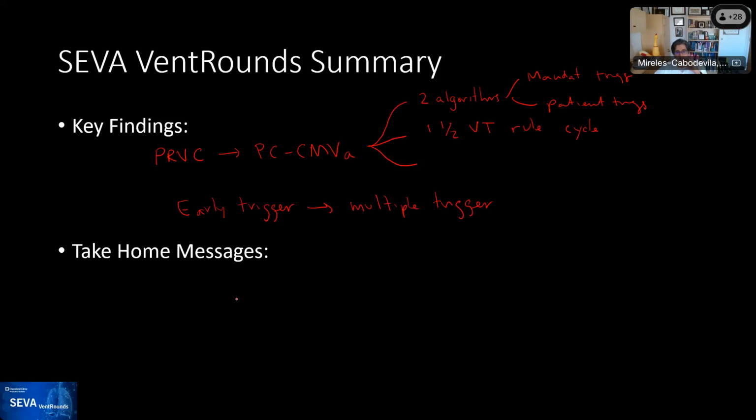So what I would say in general as a take-home message is that you need to learn this careful observation of your ventilator, which will give you more insight into what is only on the manual or may not even be mentioned in the manual, what you cannot see.